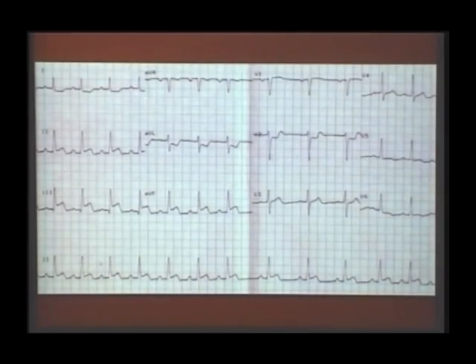So if the ST is coming towards your inferior leads, it is going away from your superior leads. So superior leads will show what? ST segment depression. So whenever you have an ST segment elevation, L1 and AVL showing ST segment depression is called reciprocal depression, which indicates the ST vector is acutely coming towards inferior leads and going away from your high lateral leads.